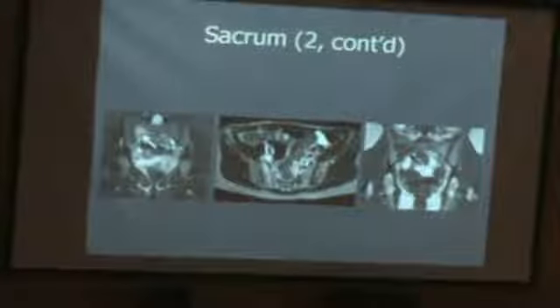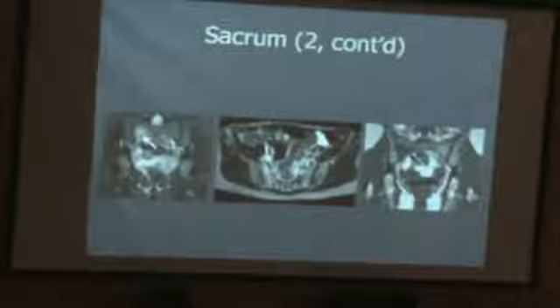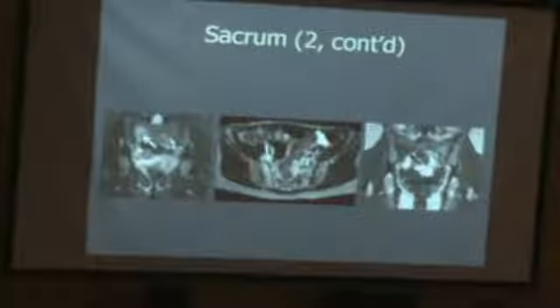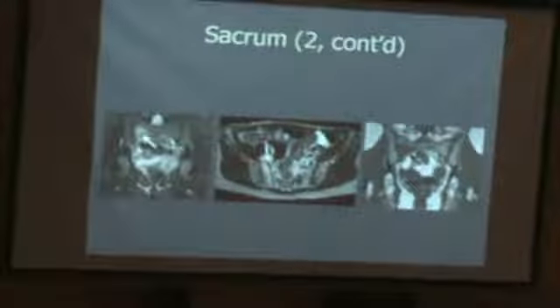Sometimes I want to draw your attention to this. When the lines are bilateral, you have a bilateral fracture of the sacrum, and if you go very quickly in the interpretation, I saw that 2 or 3 times, especially with residents, they look at it very quickly and think that this is an articulation. Of course, right now I'm showing it to you, but you see this in 10 MRIs when you interpret, and it's bilateral.